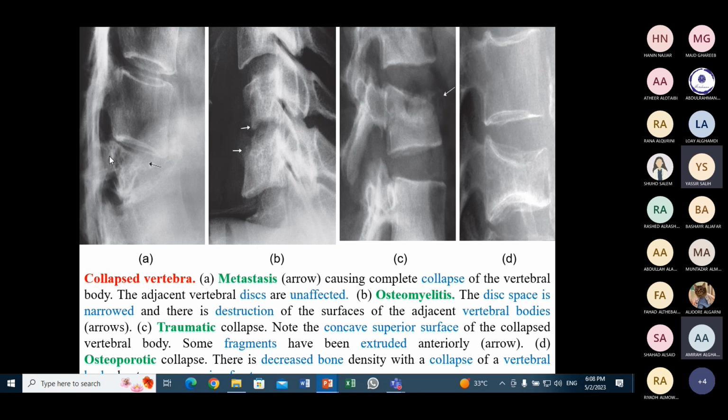Although you can see there is a lytic lesion. يعني it is not totally normal، لكن يعني if we do oblique view this pedicle will be more clear than this. أهم شيء إنه عندنا small vertebral body with multiple lytic lesion. النقاط السوداء دي lytic lesion with normal intervertebral disc spaces. This is a طبعا البيشنت كلينيكالي ممكن يكون عنده برايمري نعرف إنه this is شنو vertebral collapse vertebra due to metastasis.